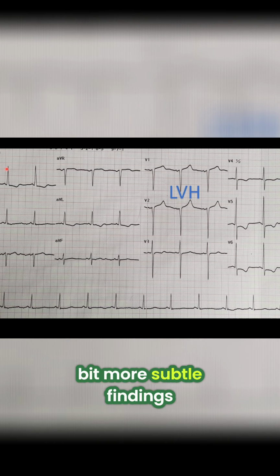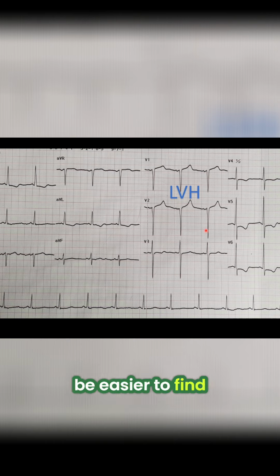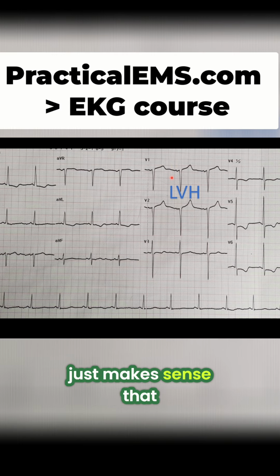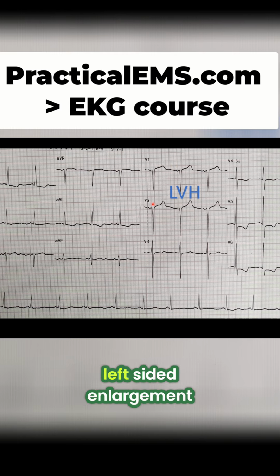Those are a little bit more subtle findings. Again, typically it's going to be easier to find them over here in your precordial leads. Another common finding with LVH is a biphasic P wave, which is an indication of left atrial enlargement. Just makes sense that it's also associated with left-sided enlargement.